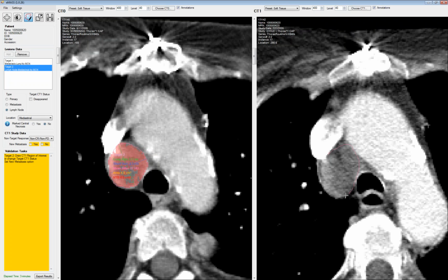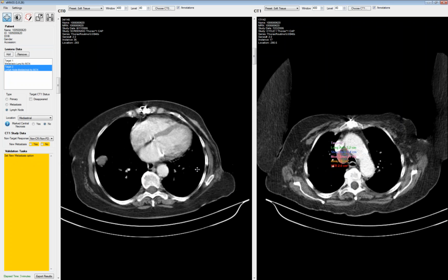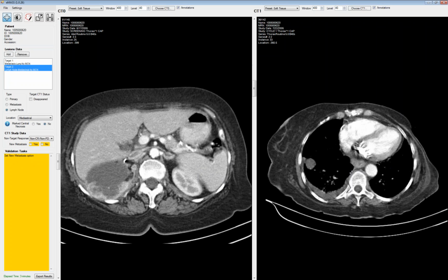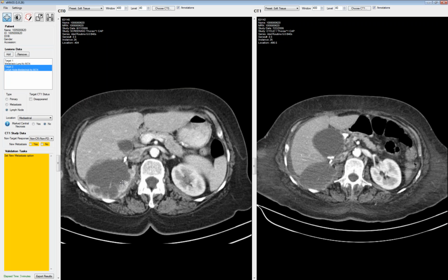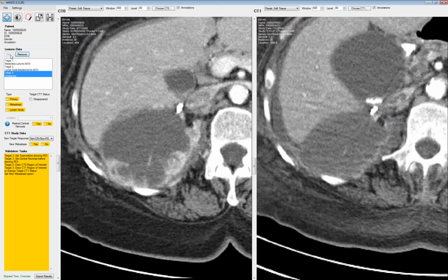And I'm going to go ahead and draw it over here. We're going to pick up the pace a little bit here so I can get several target lesions and get to the end. So we've got that lymph node drawn. That was just one example. It was telling me that lymph node was too small and not suitable for use for RECIST and for choosing as a target lesion. So let's come on down to this lesion here that's in the retroperitoneum, kind of invading the liver. I want to be on the right phase. You'll notice it's really washed out quite a bit in terms of the amount of contrast that's in there. Here's some clips here. We'll go ahead and zoom in. Very easy to use. I really like how this works. It's actually a little bit better than my actual real PACS that I use.